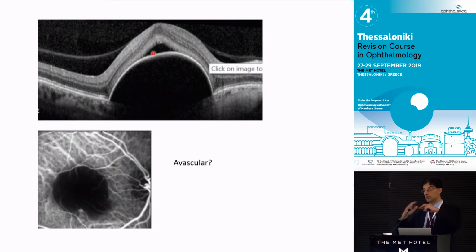a little peak fluid at the top. That doesn't mean it's CNV. If you look at the ICG, you have a hyperfluorescent notch. So this is a vascularized serous PED. If you'd not looked at every slice and not cut through the bottom, you'd have missed it.